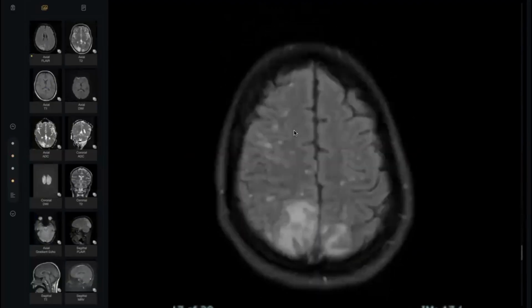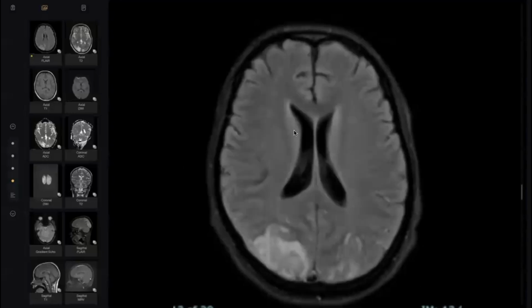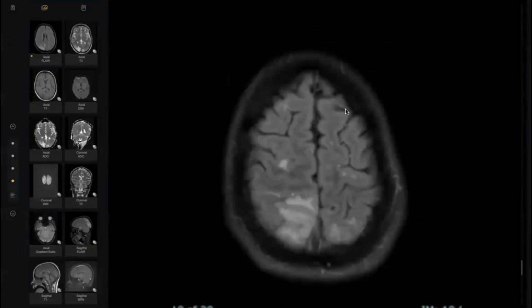By the way, my colleagues, this case may be a long case, long reporting. But he will not bring all this sequence. He will bring one or two sequences from each stage of this one. Okay, like this. What happened here, my doctor?